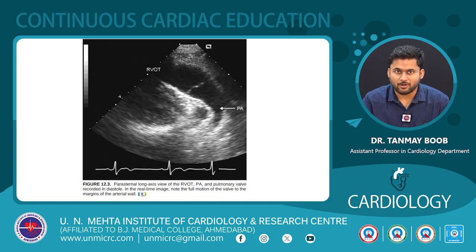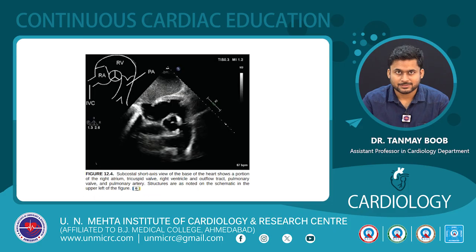This is the parasternal long axis view demonstrating the RVOT, pulmonary artery and the pulmonary valve recorded in diastole. This is the subcostal modified short axis view of the base of the heart, which shows a portion of the right atrium, tricuspid valve, right ventricle and the outflow tract, pulmonary valve and pulmonary artery. Structures are as noted schematically in the upper left of the figure.